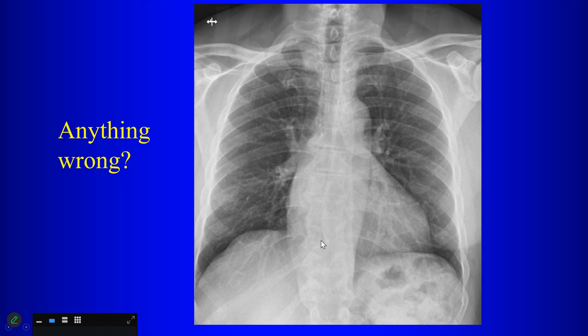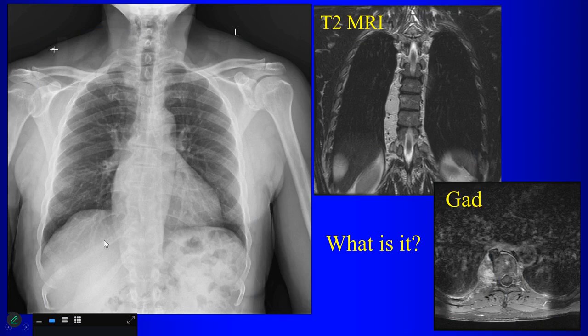Well, the abnormal line is out here, right? Yeah. You mentioned it. This is the azygoesophageal line. This is the, what did you say it was? Right paraspinal. That's the right paraspinal line. There's bulging in the right paraspinal line here, going all the way down, right? So what compartment? Posterior. T2 weighted MRI, gadolinium. What is it?